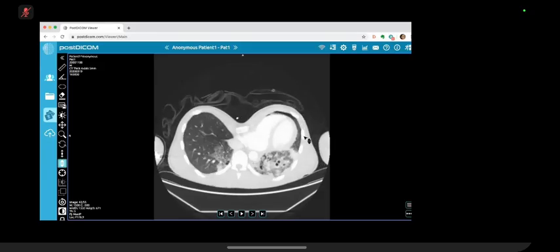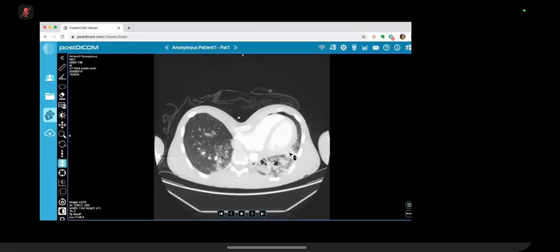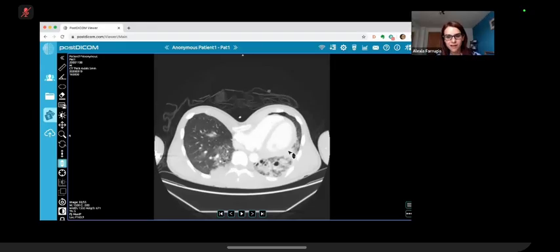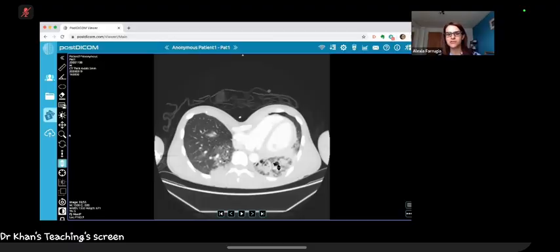Mm-hmm. Any idea what those are called? Sorry, there was a motorcycle passing. I didn't hear the last word. Sorry, I didn't catch that. Sorry, it's a pneumatocele, I think. Yes, post-traumatic pneumatoceles. That's right.